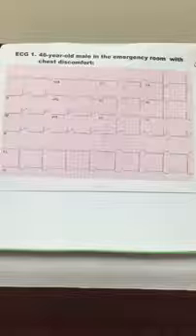I'm a third-year medical student at Western University who's currently rotating with Dr. Ben-Zur. And today I'm going to go through with you guys how to approach an EKG when you're first given one. One of the most important things to know when you're about to interpret an EKG is to do it methodically. Different doctors have different ways of approaching it, but I will go through with you today the most common way and the way Dr. Ben-Zur likes to go through it.